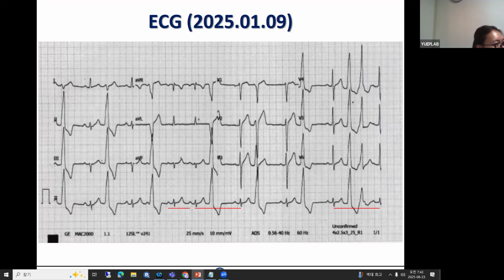And I would like to ask Dr. Cho. So when you look at the V1 to V3 QRS morphology, are you sure it is RVOT, the anteroseptal area, based on the QRS morphology? You sure? The answer lies here.